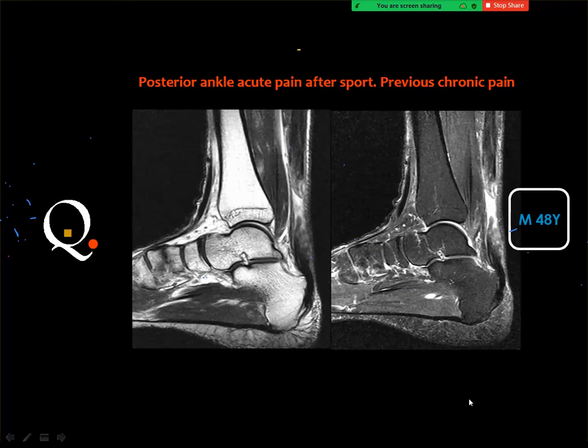In cases of a torn Achilles tendon, you measure the gap between the cut edges of the tendon and you measure the distance from the torn edge to the insertion site in the calcaneus. And in the previous days, we used also to mention what is in the gap.